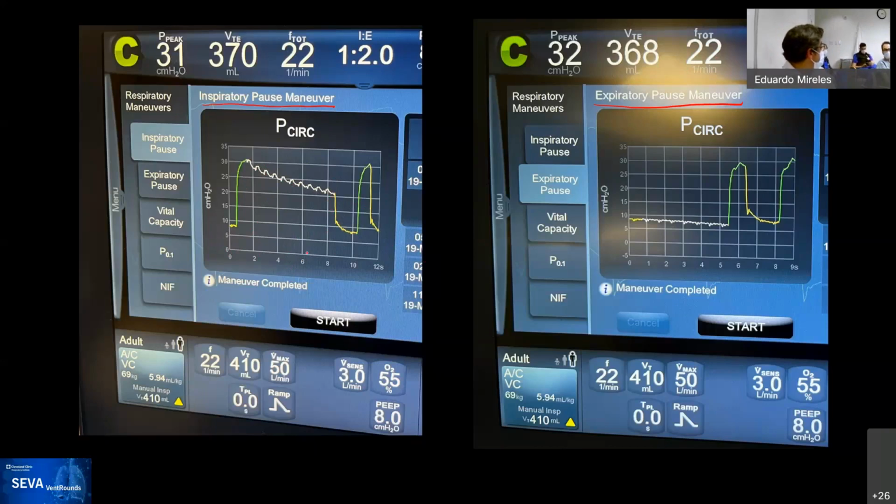How about a leak within the patient himself, like a bronchopleural fistula? So a type of leak. So the circuit is not closed, right? It's not maintaining the pressure in a zero flow state, and that should be because either the cuff is leaking, or something is not tied up on the circuit itself, or there's a bronchopleural fistula or a pneumothorax that is leaking outside.